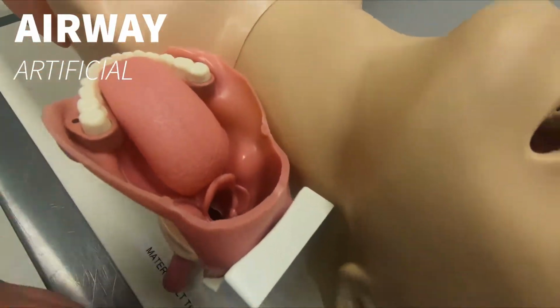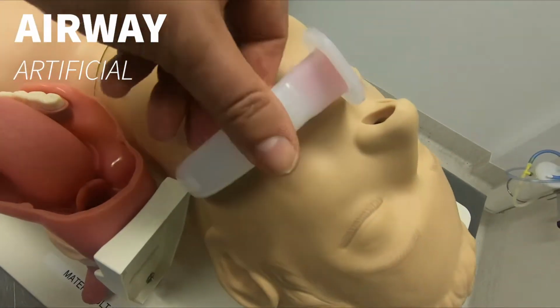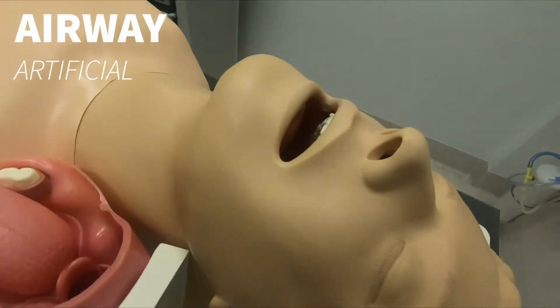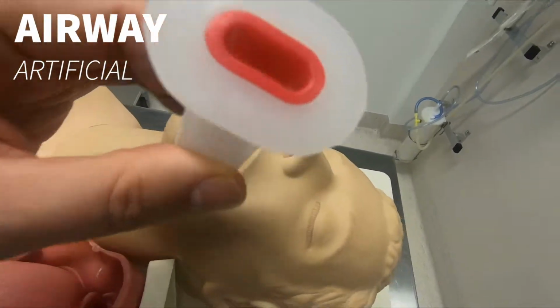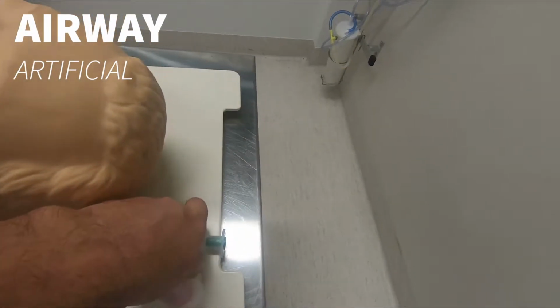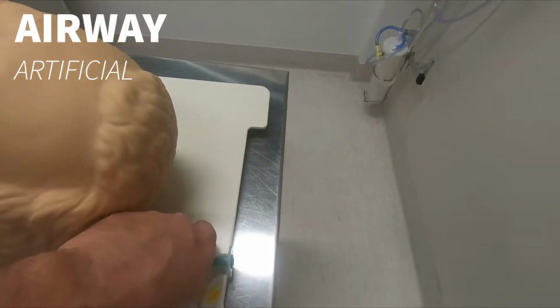So size is really of big importance. You measure from the corner of the mouth to the angle of the mandible, or the middle of the mouth, like so. So these big heads are red. I've never actually seen someone measure it, but for a bigger size head we'll need a size 5. A smaller head than this one, we'll go to 4, which is yellow, and then even smaller in the adults, we go to the size 3, which is green.